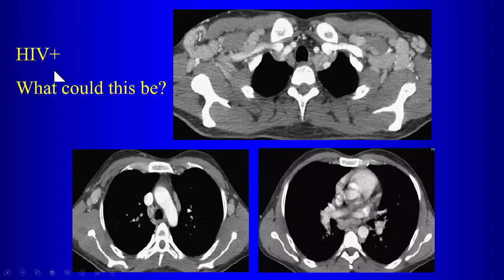So this patient's HIV positive. The finding on the imaging here is what? Enhancing lymph nodes. Yeah, so there's enhancing lymph nodes, right? Castleman. So, give me a differential of enhancing lymph nodes in patients who are HIV positive. There are three things that you can talk about. You mentioned one, which is Castleman. What are the other two? Is it Kaposi? Yeah, Kaposi's is another one.